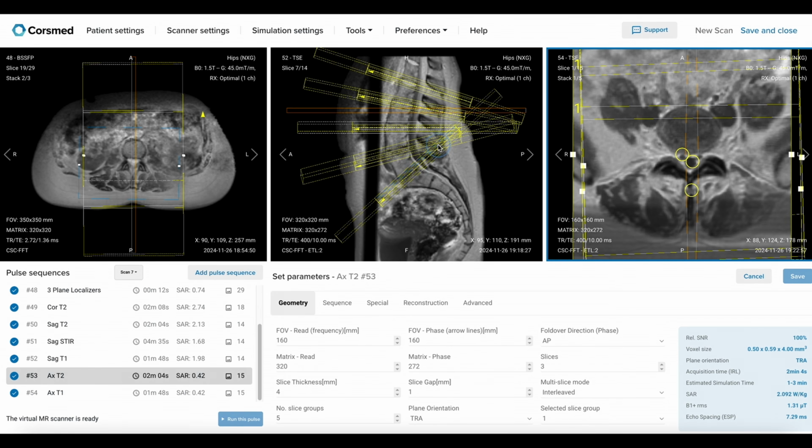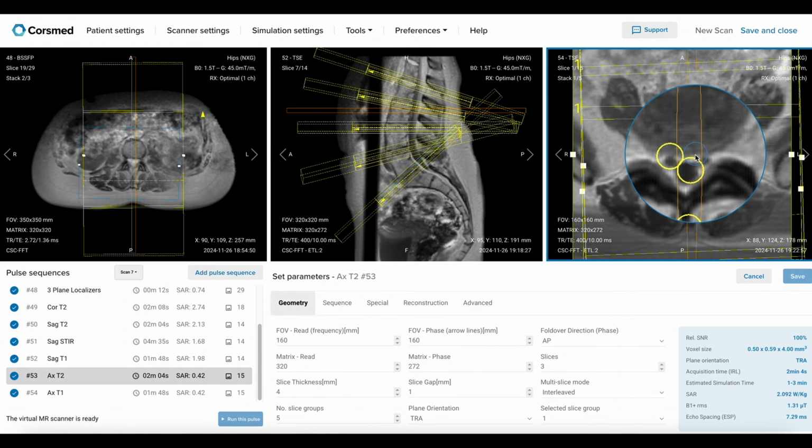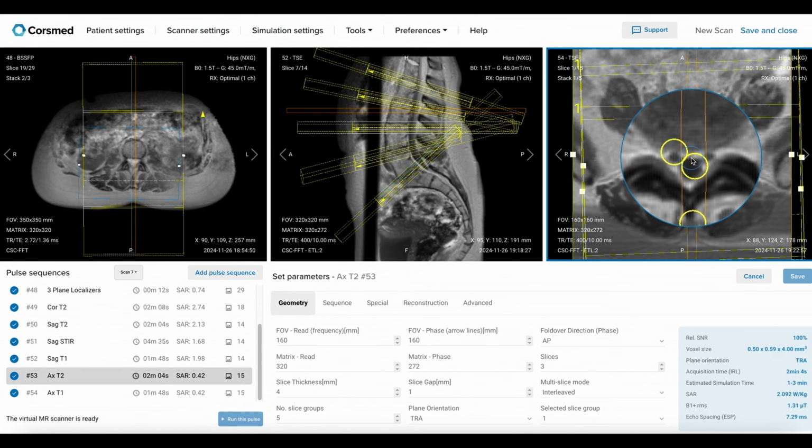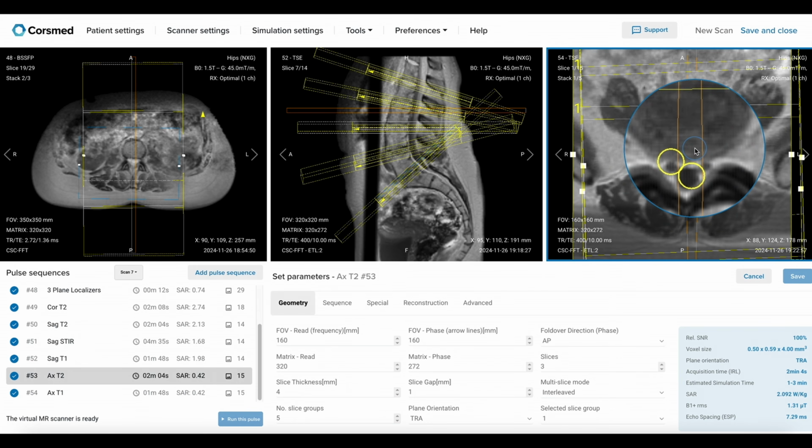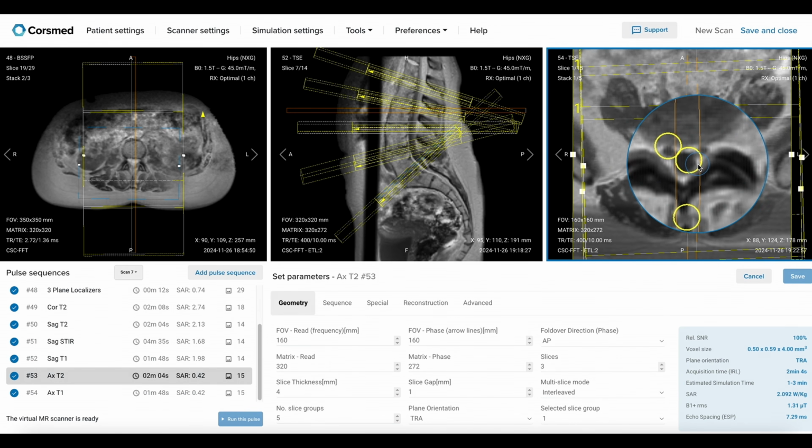Fortunately, this artifact does not extend into our region of interest, so our image is still viable to be used by radiologists when making a diagnosis. This specialized axial slice planning improves the visualization of potential protrusions or nerve impingements in the lumbar spine. Let us zoom in at our vertebral body and ensure that the crosstalk is not present in this region. Excellent.